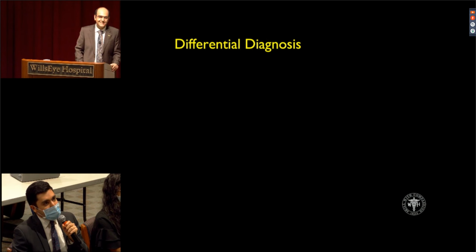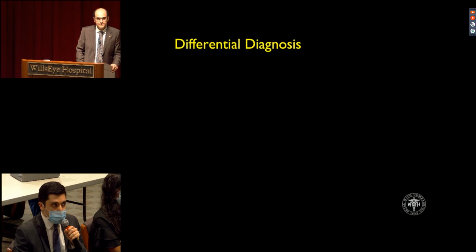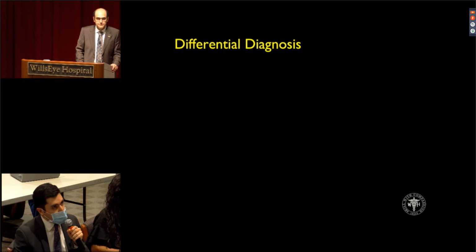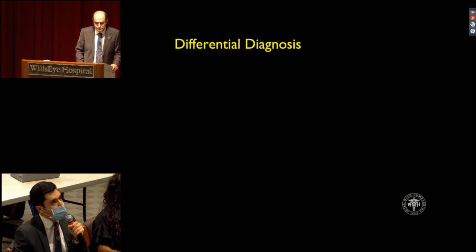And just to be broad and thorough, thinking about some neoplastic causes. Once again, lymphoma, the color photos could look like that, but again, the OCT for the most part does rule it out. And then autoimmune retinopathy could cause outer retinal changes like that. In a young patient it might not be the case, but definitely something I'll inquire about in the history.